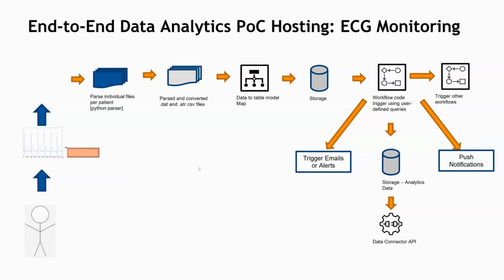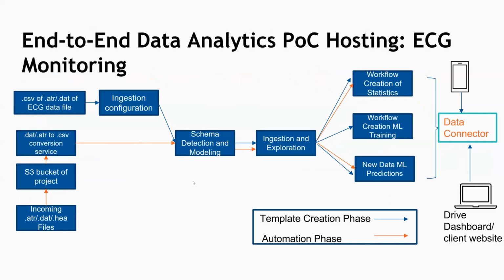Suddenly we are able to see a light at the end of the tunnel for an otherwise large undertaking. The engineers and the company are happier. We'll achieve the above in DeepHouse using a two-stage process. Nothing too fancy. We call it the template and automation phase.